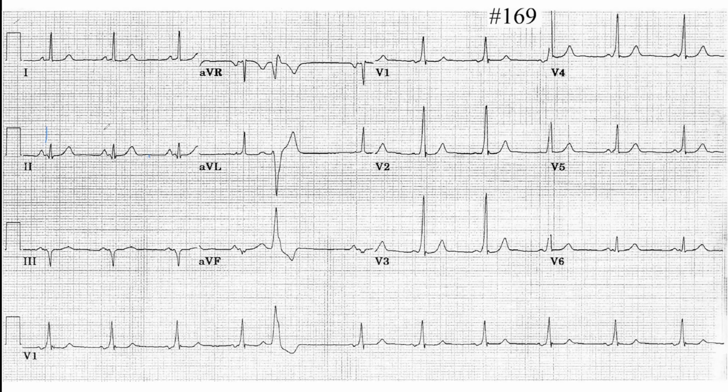Do we have a P wave? Yes, we do, and it's the normal one, the sinus P. It looks like a normal sinus. All P waves are followed by a QRS. Very good. The morphology of the P wave looks normal. PR interval looks normal. QRS, is it wide?